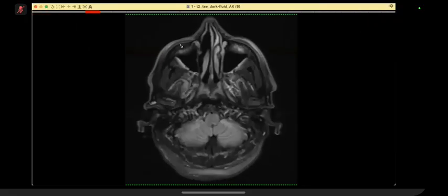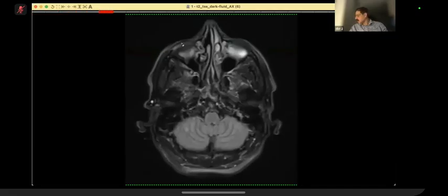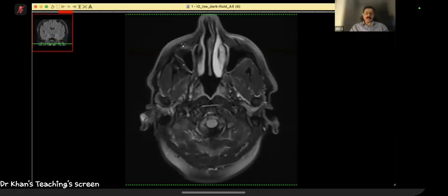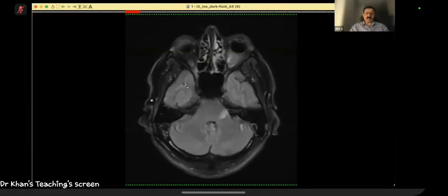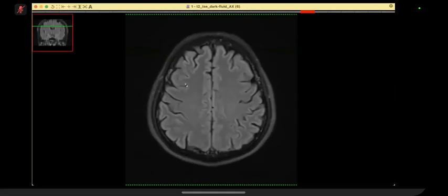Okay. So this case is an interesting case. I will tell you how it happened. This is a 54-year-old, and this was an outpatient scan. On this outpatient scan, the patient has got leg paresthesia, which is irrelevant for you. Don't worry about it, because they had done an MR also. But paresthesia of the left side of the face. So that was the history. Now with that, if you see here, which sequence is this? This is a FLAIR sequence.